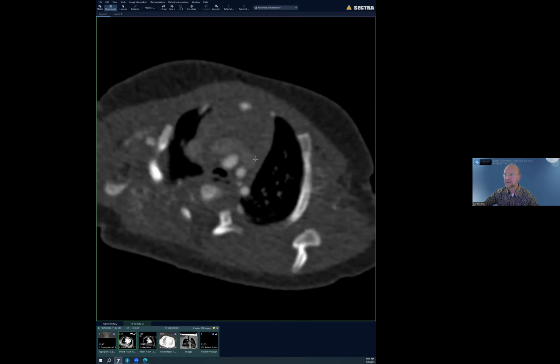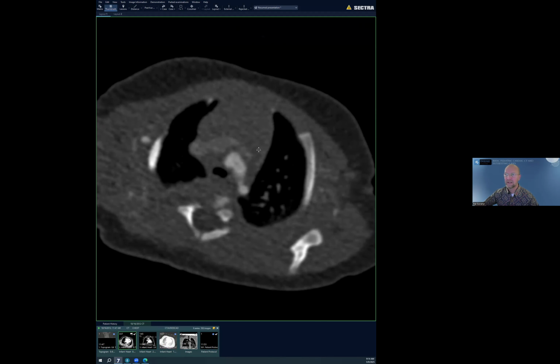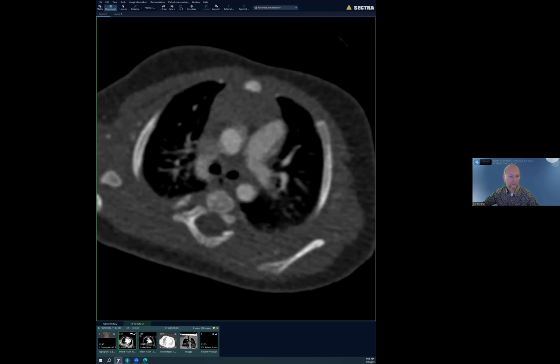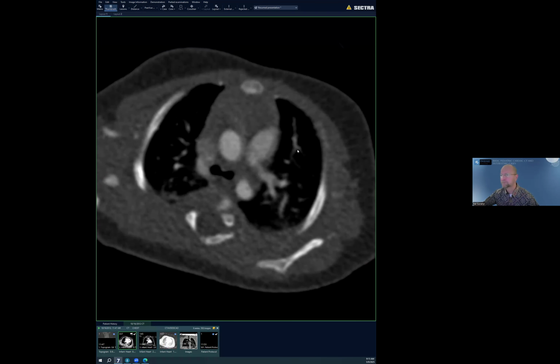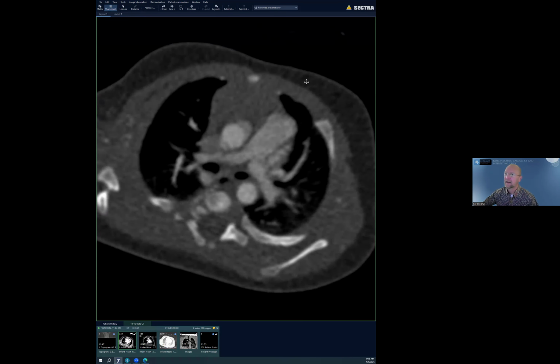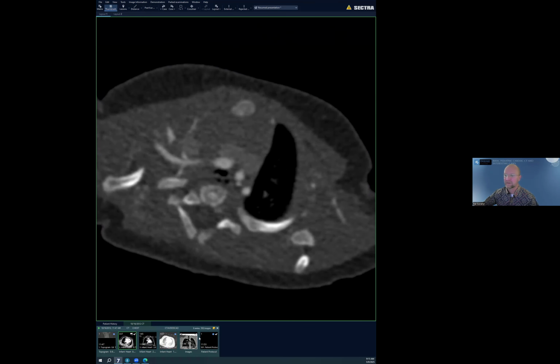So in this patient's case, the reason for the tracheal narrowing and the pulmonary symptoms and recurrent infections or asthma, I don't remember exactly the story, this was a couple months old child at the time, was caused by the brachiocephalic artery.